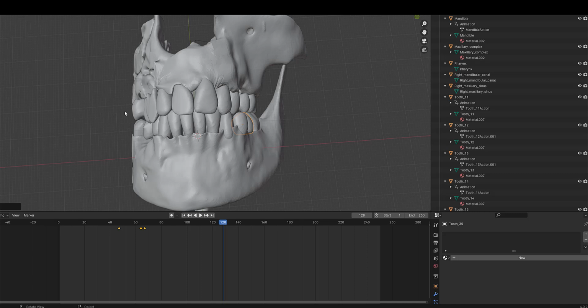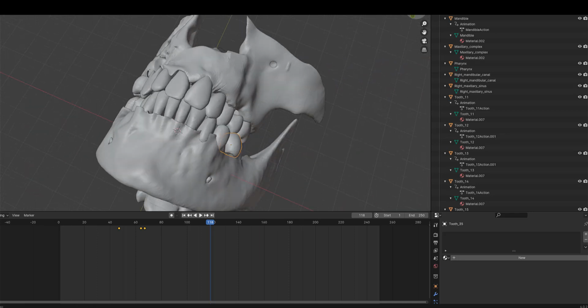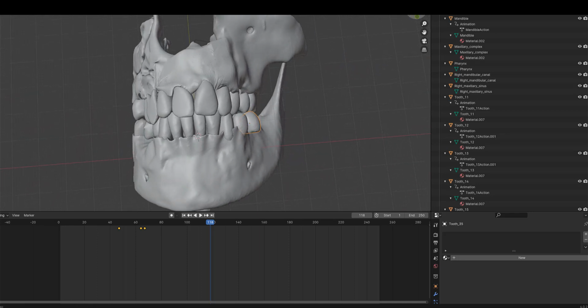This is designed to let you better understand what is supposed to be done prior to the bone grafting and what you can expect if the bone graft is successful when you guide the dentition into its final position. So this is basically a simulation. As you can see right now, we simulate all the movements, and at the end we end up with an acceptable result that needs to be further refined.